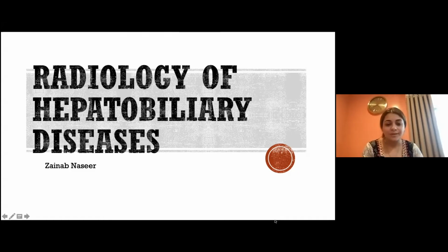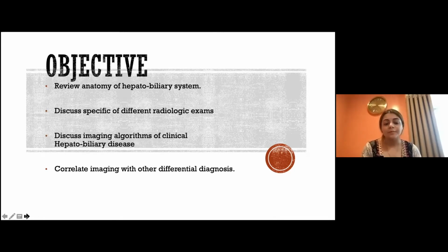So today I will be presenting on radiology of hepatobiliary diseases. My objective would be to review the anatomy of the hepatobiliary system on a plain radiograph and different radiology films, discuss the specifics of different radiology exams, the algorithm and the clinical hepatobiliary diseases, and correlate the images with differential diagnosis.